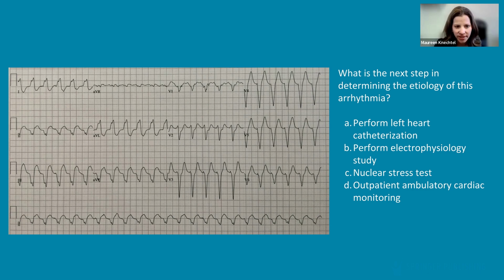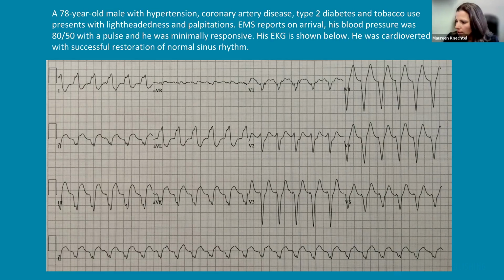Okay. What's the worst that could happen? Death and dying. We want to try to avoid that. So you want to treat it like VT. Let's go back and show you the slightly bigger one. Okay, so with VT, one of the most important things you want to try and look for is complete heart block, AV dissociation, because think about what's happening.